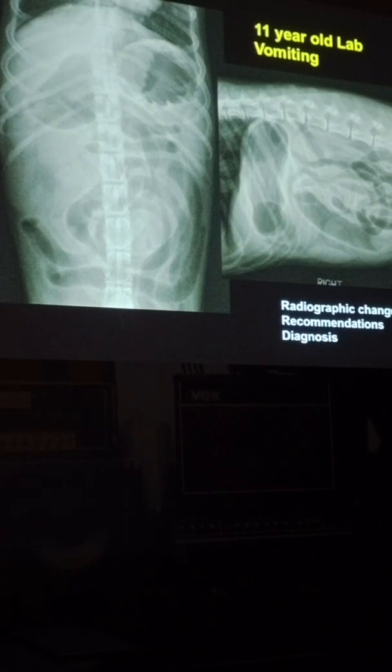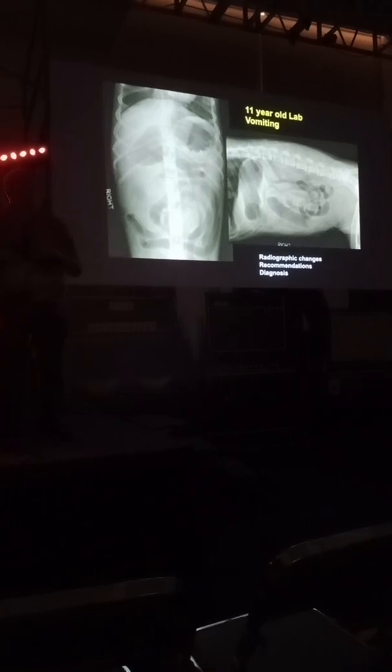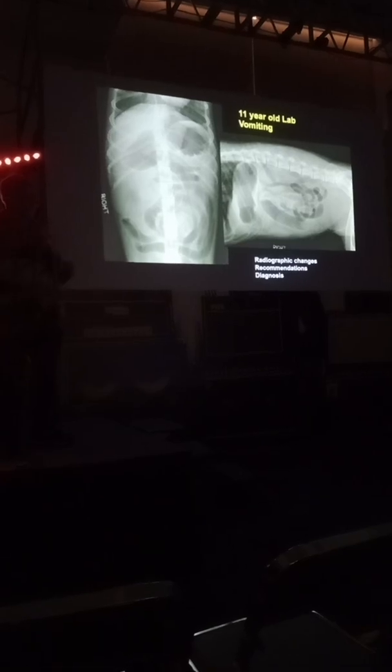What were the other key words? Segmentally distended. It's segmentally distended. It should be non-uniform small bowel, right? Multiple populations based on size or width. Even though you've got gas in these loops of small intestine, they're normal. They're not abnormally dilated. So this meets the criteria of an obstruction.